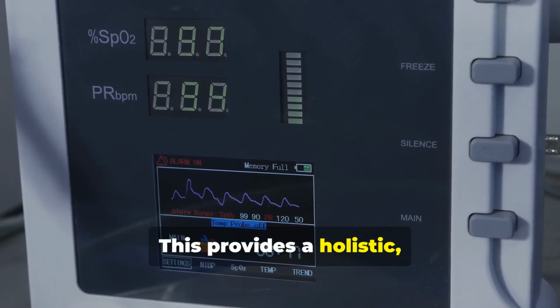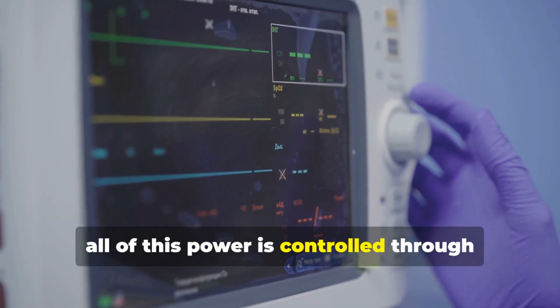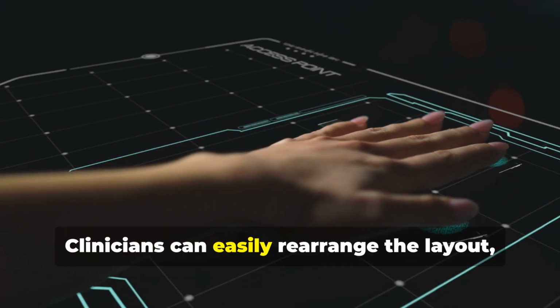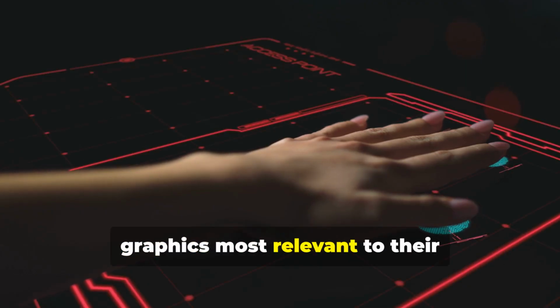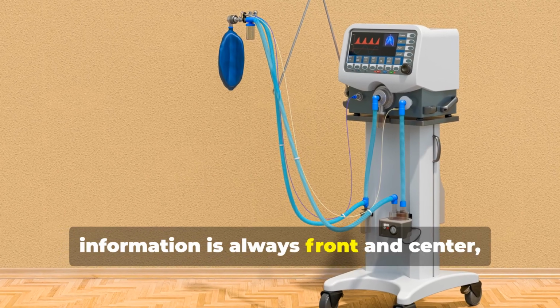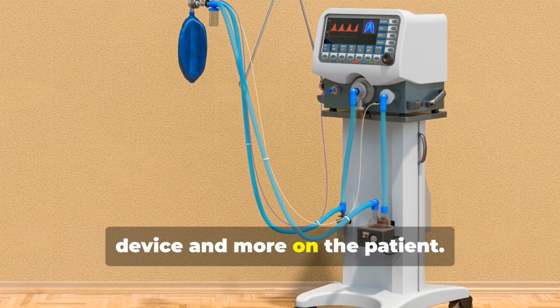This provides a holistic, single-source view for a complete patient assessment. Finally, all of this power is controlled through a highly intuitive and customizable touchscreen interface. Clinicians can easily rearrange the layout, prioritizing the parameters and graphics most relevant to their patient's specific condition. This flexibility ensures that critical information is always front and center, streamlining workflow and allowing the clinical team to focus less on the device and more on the patient.